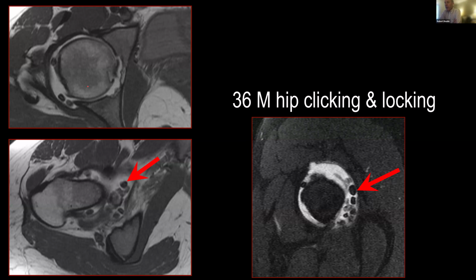Other things we look for on radiographs when we're looking at FAI, whether it's a CAM or pincer type, would include looking for the posterior wall sign, and maybe we can do another session to go over measurements, but looking for just focal acetabular retroversion on an AP pelvis, and that being a predisposing factor to FAI.